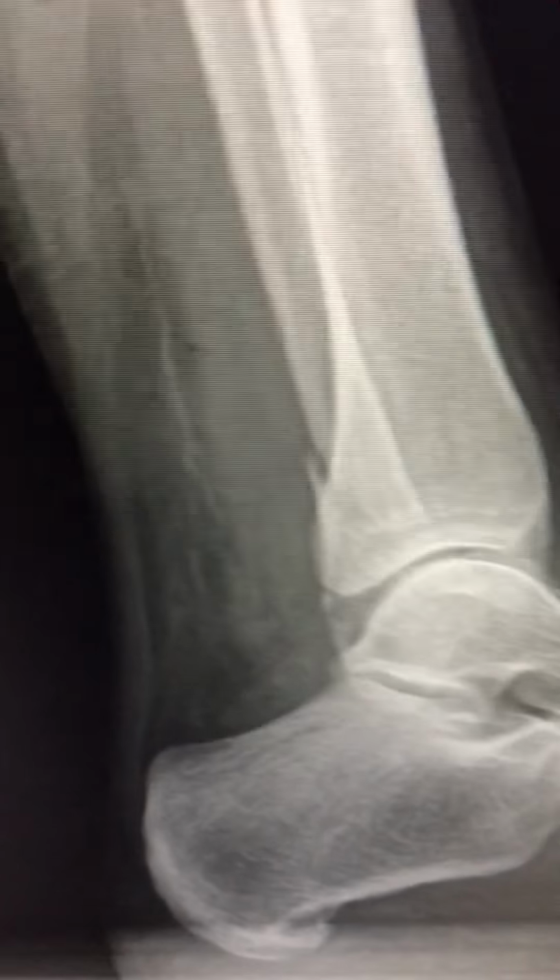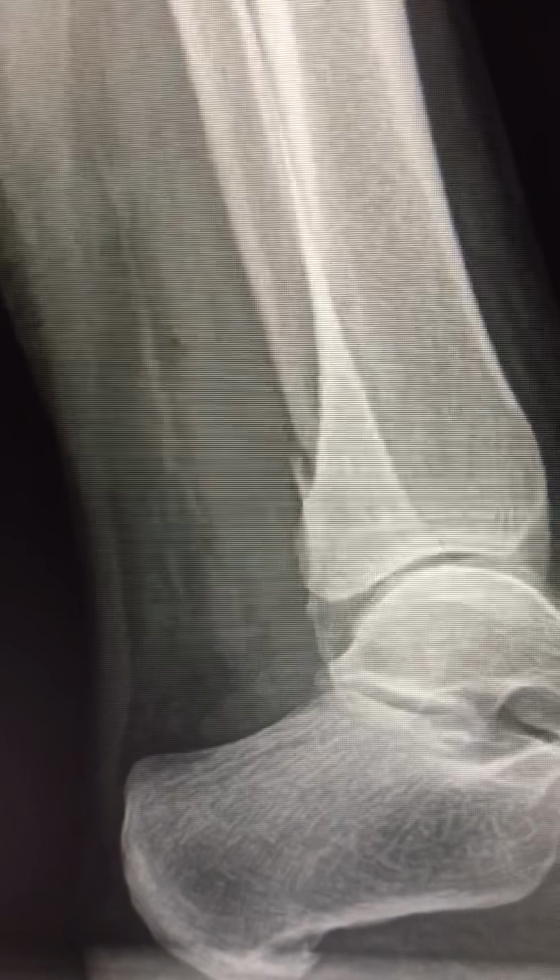We're going to go over these ankle fractures. The second break, as you guys can see, which is going downwards of the fibula, and a spike, as we can see in the gapping. We will see them further as well. Now, furthermore, you can see that as well here. So there is a little bit slight shortening, and there is gapping of the bone. So we're going to look at them as well. You can see a little bit of the bone should be further slightly down and more connected.